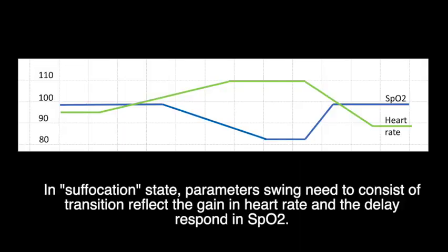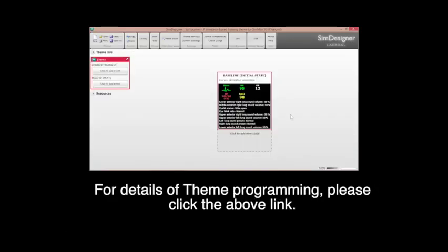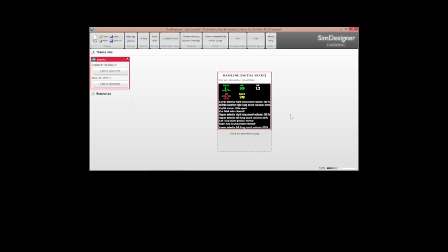Demonstration of theme programming with parameter compensation transitions. In suffocation state, parameter swings need to consist of transitions that reflect the gain in heart rate and the delayed response in SpO2. For details of theme programming, please click the above link.